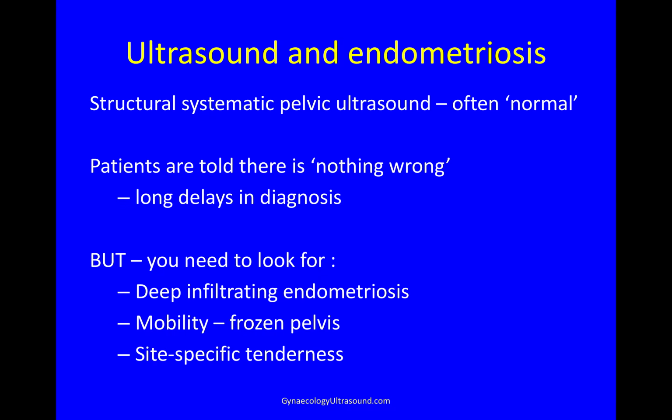A pelvic ultrasound, though, is often said to be normal, and patients are told that there is nothing wrong, which leads to long delays in diagnosis. But you need to look for deep infiltrating endometriosis, mobility of frozen pelvis, and site-specific tenderness on ultrasound to make the diagnosis.